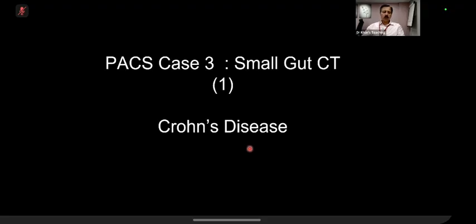Okay, I am going to show you a CT scan, and this is a brilliant film because so many CT films now come in the exam. Once you know the same pathologies, the same pathologies that you can see on a barium, you can see on a CT scan and things like that.